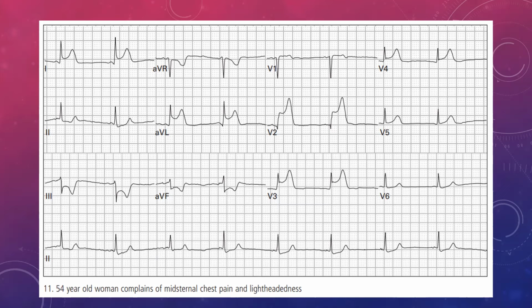So you can decide in your own practice, wherever you're working, whatever sequence you like to look at things. Now, I'm just giving you my sequence because it's just how I've done it over the years. I've been doing this now for more than 20 years. So it's kind of stuck with me. So I'm just going to go through it. I like to look at the inferior part of the heart first. So that's leads 2, 3, and AVF. And what we can see in leads 2, 3, and AVF are quite severe ST depressions that you can see here, right? So these are quite severe ST depressions.